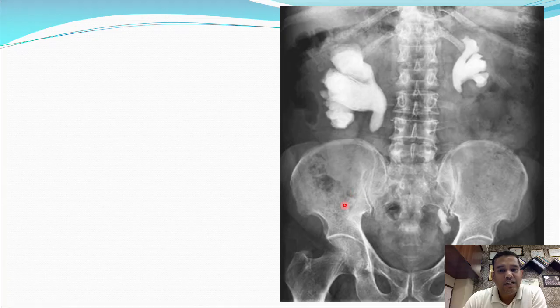So next X-ray, what is this X-ray? Is it a plain X-ray or a contrast X-ray? Remember one thing, what I have told you already. If there is something that is whiter than the bone, it can be a contrast, it can be a stone, or it can be a metal. So in this case, this is a renal stone because it gives a picture of the kidney. So this is the staghorn calculi. So there is radio density, so it does not mean it's a contrast X-ray.